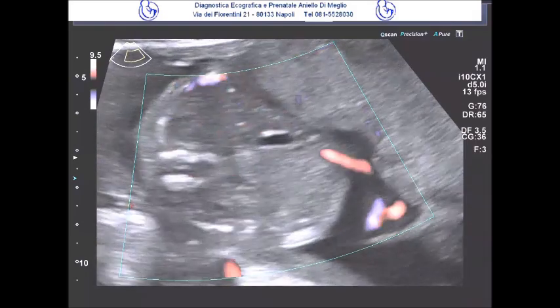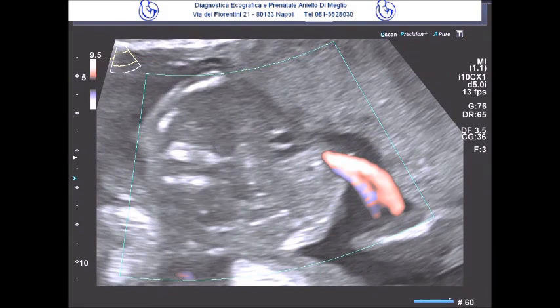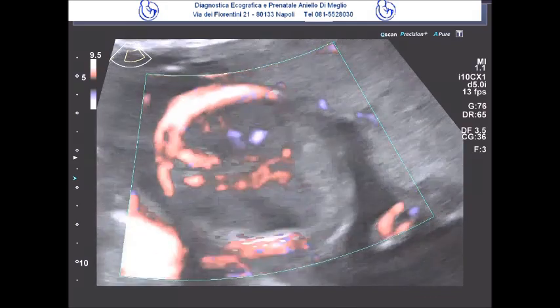The identification of this second anechogenic formation requires differential diagnosis with other cyst-like formations affecting the fetal abdomen. The position and ultrasound characteristics allow us to rule out certain conditions, in particular the choledochal cyst, which appears as a rounded formation near the liver, specifically along the intrahepatic portal segment of the umbilical vein.